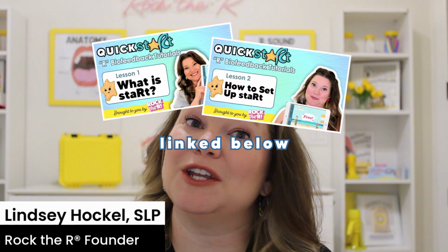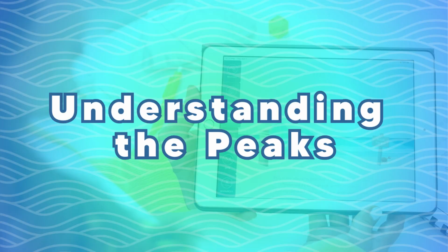If you've ever looked at the StarT app wave and thought, what am I looking at? This video is for you. We're in part 3 of the QuickstaRt tutorials. Previous videos are linked below. Let's dive into free play.